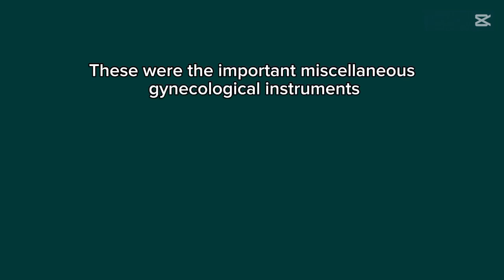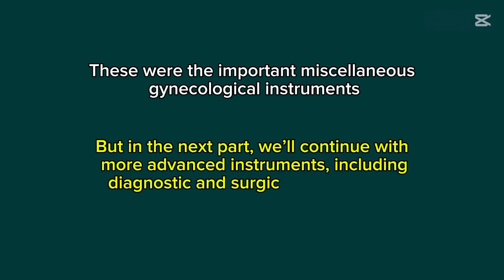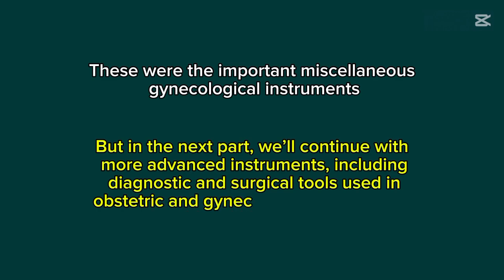These were the most important miscellaneous gynecological instruments, but in the next part, we will continue with more advanced instruments, including diagnostic and surgical tools used in obstetric and gynecological procedures.